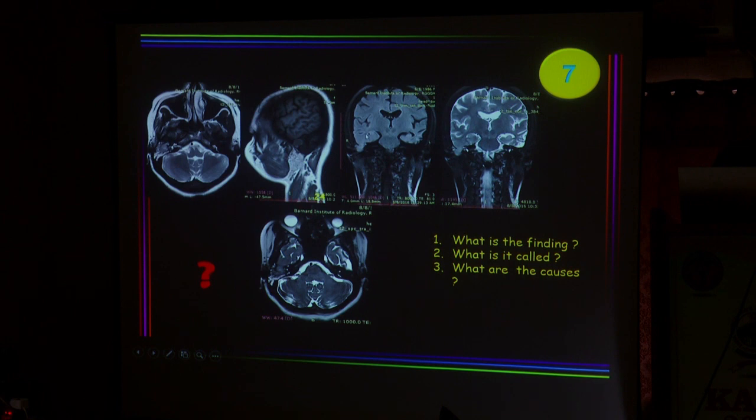Okay, I hear some voices saying encephalocele. You can see where there's a focal herniation of the temporal lobe through a defect in the temporal bone into the middle ear. So this is called fungus cerebri.